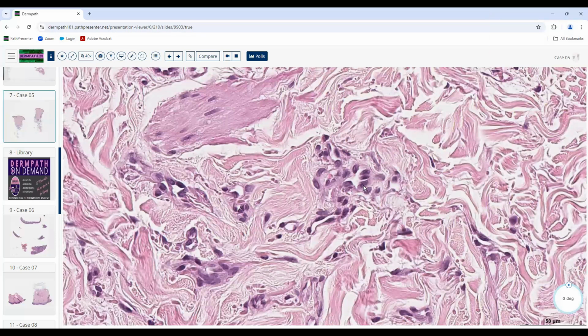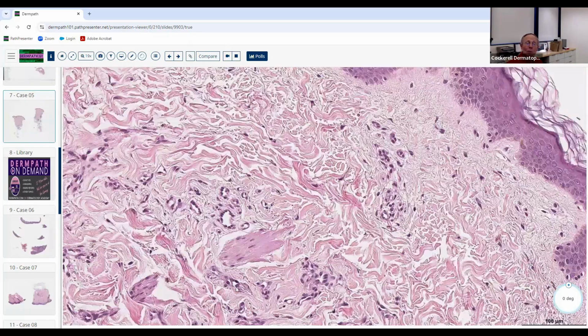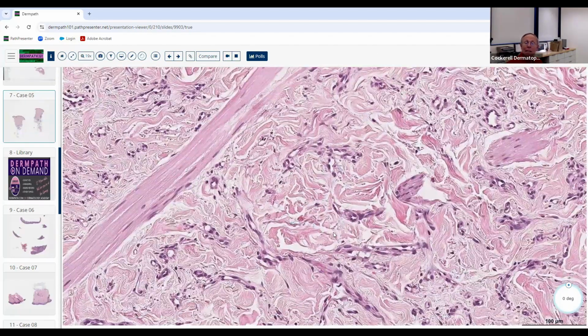That it is single-walled. Well, notice that these endothelial cells are plump and large. And that's not usually seen in an angiosarcoma. If they are large, they're very atypical. They may be floating freely inside the lumen of these irregular staghorn, bizarre blood vessels. But we see a well-defined vascular lumen like this that's lined by these large plump endothelial cells protruding into the lumen that don't have any atypia or any mitotic figures. That's helpful for a benign. That's more commonly seen in benign lesions.